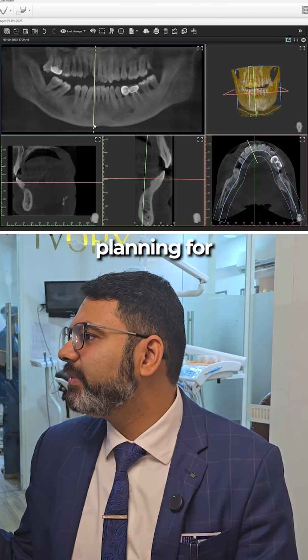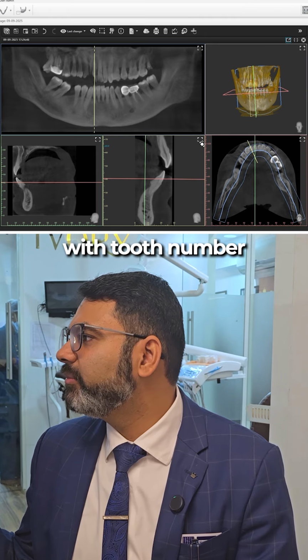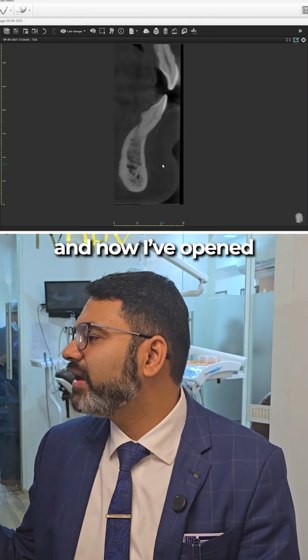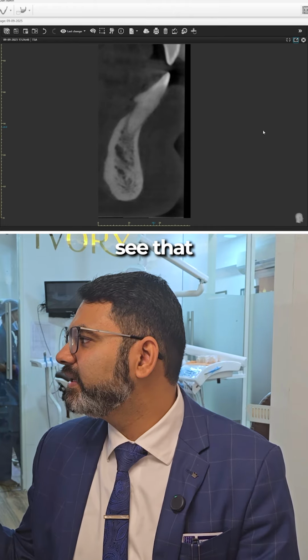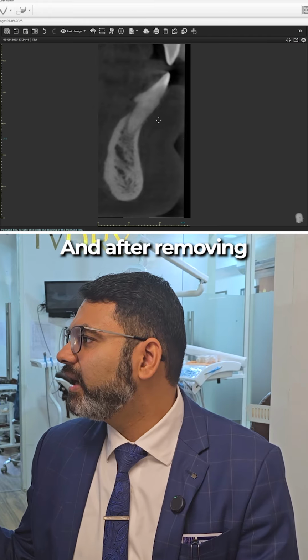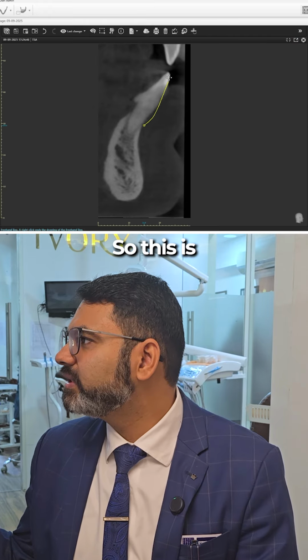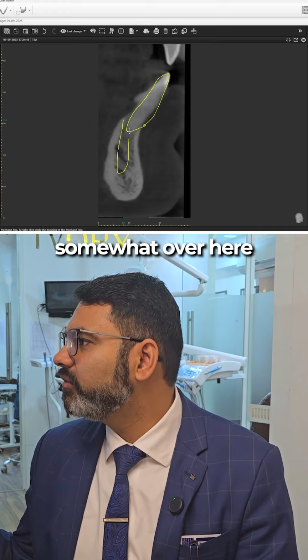For example, here I'm planning for Mr. Vijay an implant placement after extraction with tooth number 31, 32, 41, 42, and now I've opened a sagittal section view of this case, where we can see that there is a lot of bone loss and we have to remove these teeth, and after removing we need to place an implant. So this is the particular tooth and I'll be placing the implant somewhat over here like this.